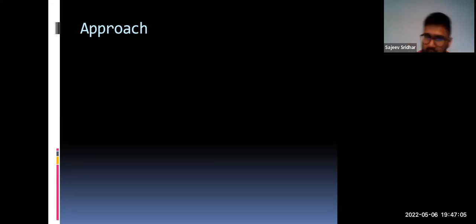And I know that the cross sections that I've showed you were very wide. They were not really that detailed, but if ever you do request a CT scan, you'll be given 5mm cross-sectional images, and you'll also be given 0.5mm cross-sectional images. It ranges from hospital to hospital, but in most of the hospitals in the UK that I've worked in, they always give you these two options.